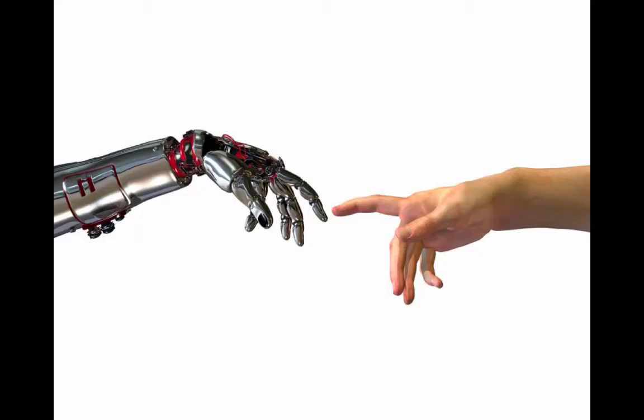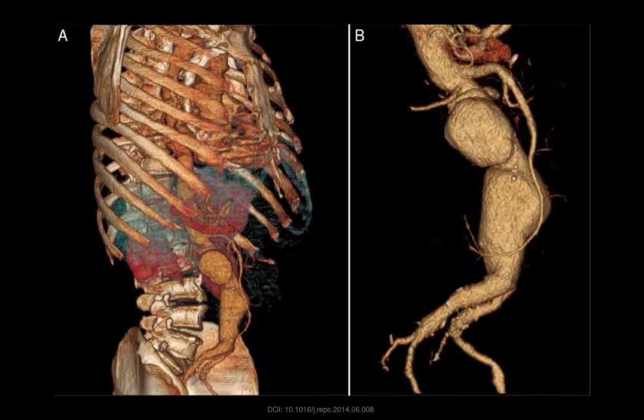All right, some future considerations. I bring this up because I think we're really at a crossroads. We're hearing more and more about the use of artificial intelligence and scanning protocols and helping us with making diagnoses, making point of care ultrasound easier. And I think we're going to see more and more of this come down the road.